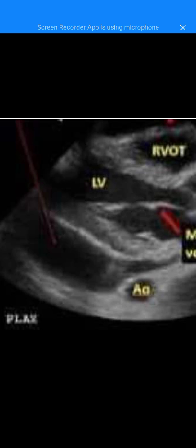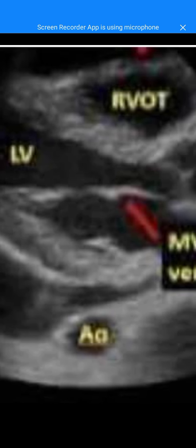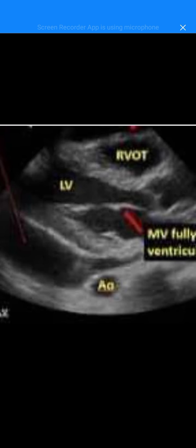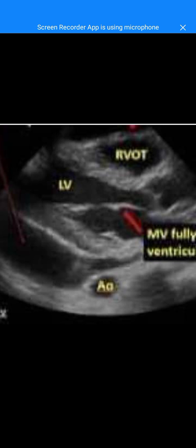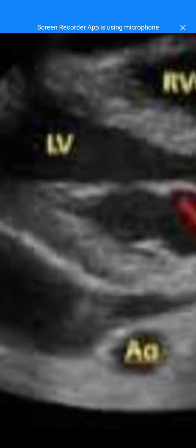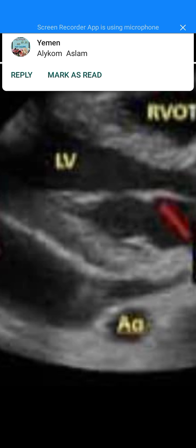There is usually just a little amount of fluid under normal circumstances, less than 50 milliliters, to enable the heart to move smoothly. So when there's too much fluid in there, what does it do? There's a separation now of the parietal pericardium membrane, causing an echo-free zone which lies anteriorly to the descending thoracic aorta. So this is how you differentiate the two.